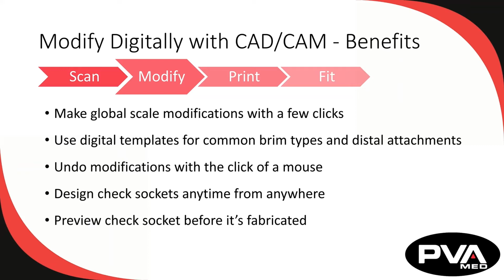Another benefit is that we can use an electronic preview function to check a check socket before it's fabricated. So we can preview the check socket, spin it around, look inside it, and look for anything that might look like structural issues that could impede the ability to do a static and a dynamic test with the patient.